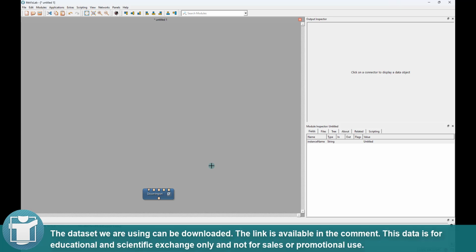The dataset we are using can be downloaded. The link is available in the comment. This data is for educational and scientific exchange only and not for sales or promotional use.